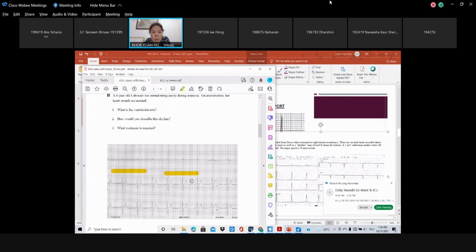What do you think about the P wave? Do you see P wave? No P wave. So there is no P wave and all you get is the QRST.